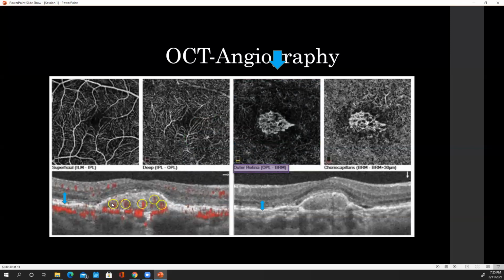And then finally, if you look, here are the areas of red which are showing in the cross section red, which is flow. Now I'd expect it up here because this is where the retinal vasculature should be, and this is where the deep capillary plexus should be. But if I look here, there shouldn't be stuff bowing into the retina and having these red areas. This is flow that's happening because we did multiple B scans through this location and there was a change in our image, and we presume that any change in those areas is going to be flow. And so we're showing flow, flow, flow. It must be that there's some aberrant vasculature growing here, right? And you see those areas over there.